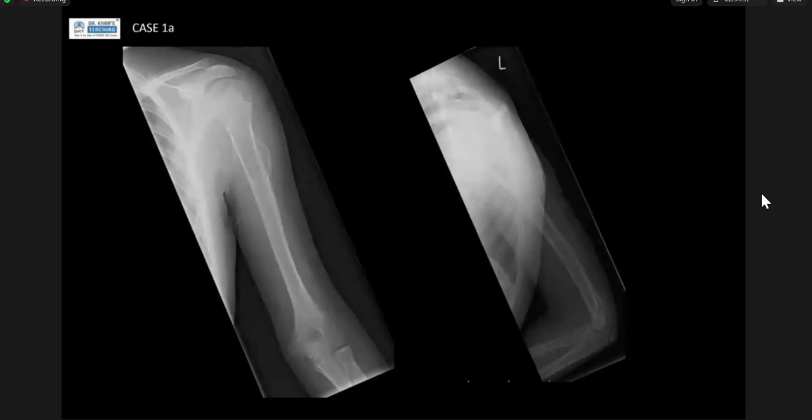Excellent. I'm sorry, I didn't catch your name. What was your name? Candidate 1. Candidate 1, lovely. Okay, that was a really nice, excellent description. I like that you ended on whether you felt the lesion was non-aggressive or aggressive. If this plain film landed in your reporting pile, with the clinical information given that this patient has pain, would you be suggesting anything?